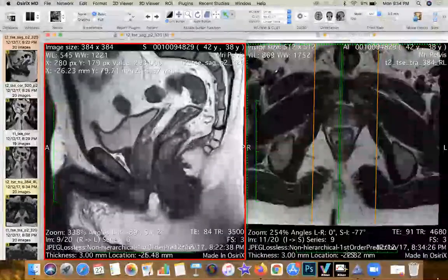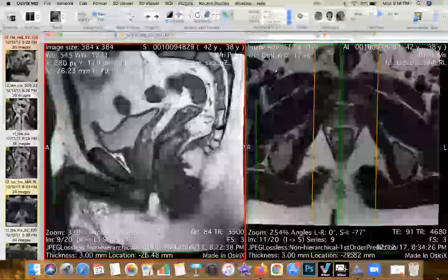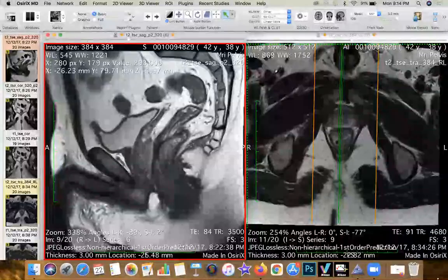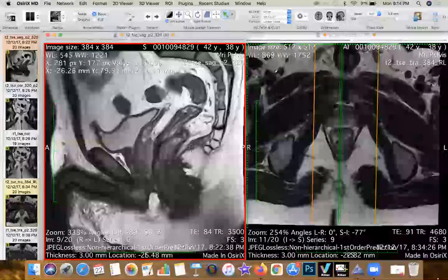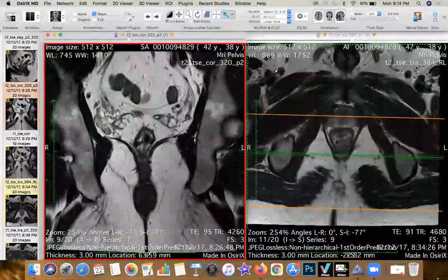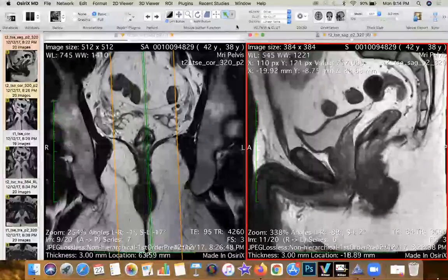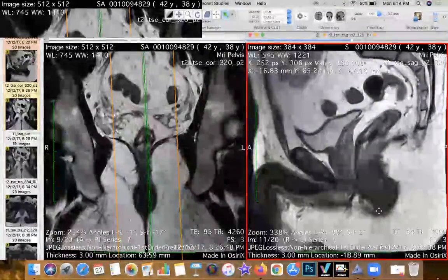So now, how do we divide the perineum and therefore get in towards the pelvic floor itself? By and large, when I look at the perineum, I'm looking at structures which are ideally located between the pelvic floor, which is what we're looking at as the levator ani out here, and what you have on the sagittal plane, if I were to just show it to you, is a structure which is located all the way up to the level of the anal verge posteriorly.